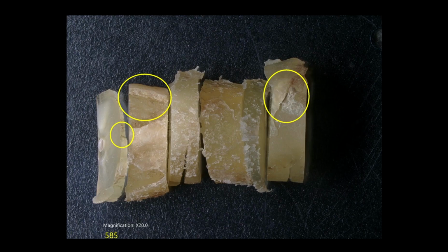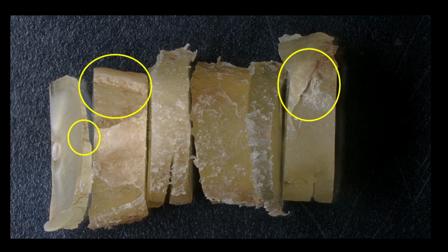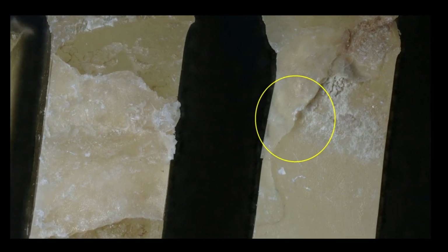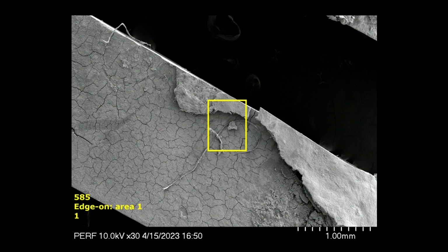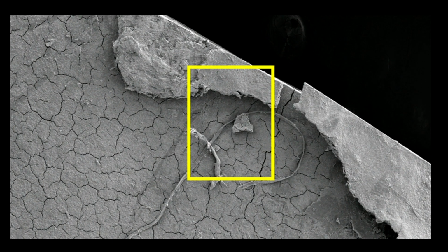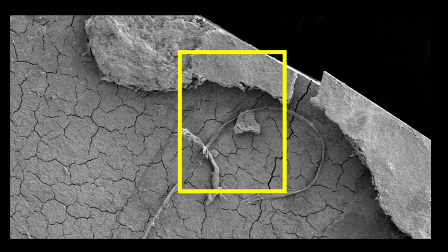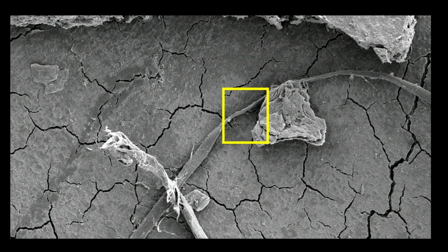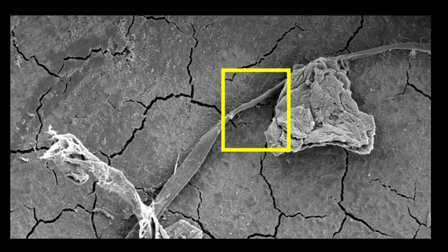And then when you look at the side, I tried many, many ways to look at this from different angles to see if we could determine anything about the etiology of the delamination effect. And we were really unsuccessful in that, but it is interesting looking at what you see against the root surface underneath the delaminated cementum.